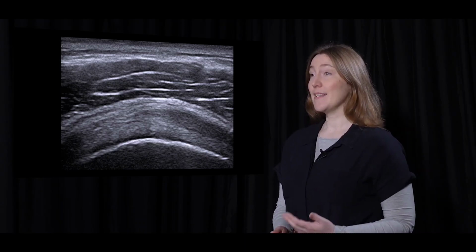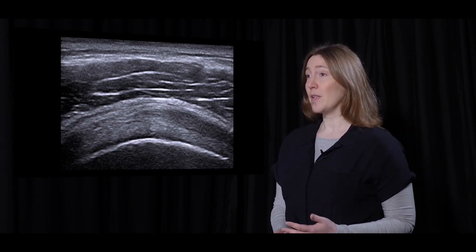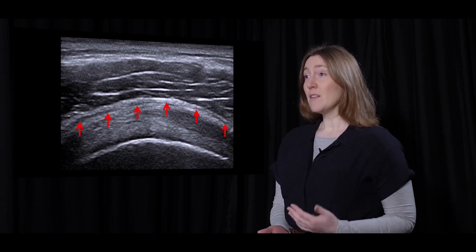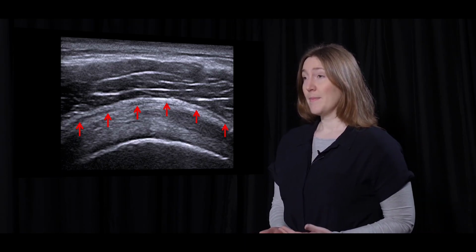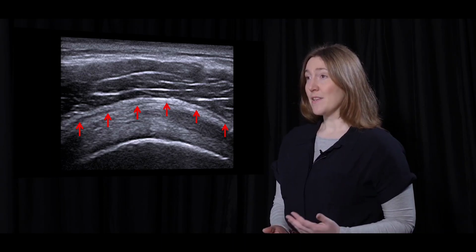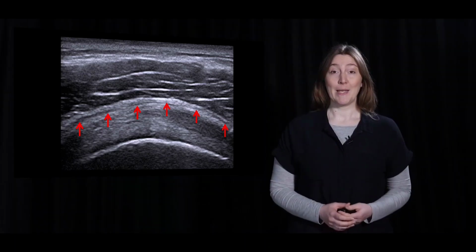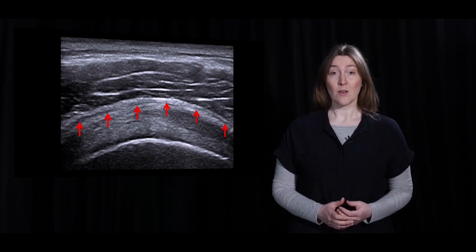In this image, we can see a transverse supraspinatus with, on top, the subacromial subdeltoid bursa, one of the bigger bursae in the human body, and the bursa that in ultrasound can be best seen in an anatomical state. The subacromial subdeltoid bursa can be seen as a thin anechoic line between two hyperechoic bursal blades. Generally, bursae are much harder to see or even invisible when in an anatomical state.